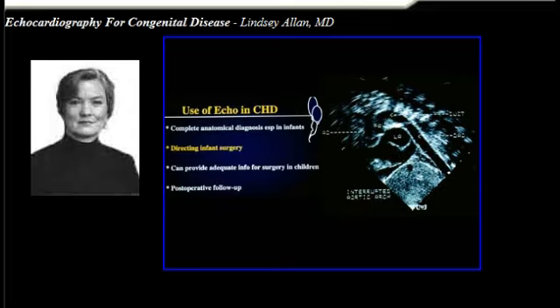So the surgeon has got to anastomose this point with this point here in this interrupted aortic arch type B. But the anatomy can be clearly displayed and allow him or her, if you have a female cardiac surgeon, that would be a nice change, to see the anatomy well and allow the surgery to be planned.